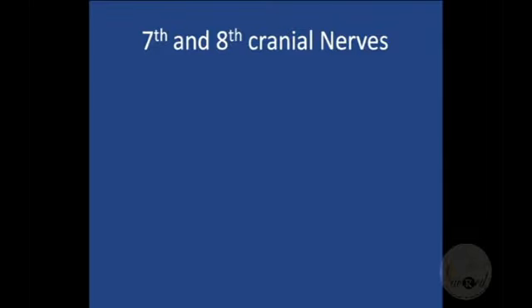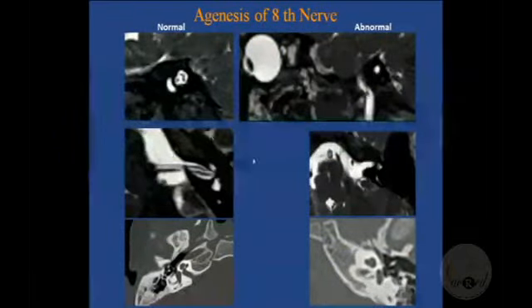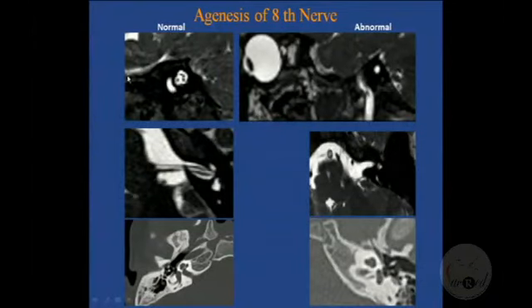Here you'll see 4 nerves. I've seen residents remembering it as 7-Up and all those mnemonics, but I don't want you to remember it in that fashion. You need to remember the anatomy. The cochlea is anterior, right? So the cochlear nerve should be anterior. The 7th nerve, the genu is on top of the cochlea. So anterior superior should be the 7th nerve, and below the 7th nerve should be the cochlear nerve, which is anterior. And the 2 nerves posterior are vestibular, superior vestibular and inferior vestibular.